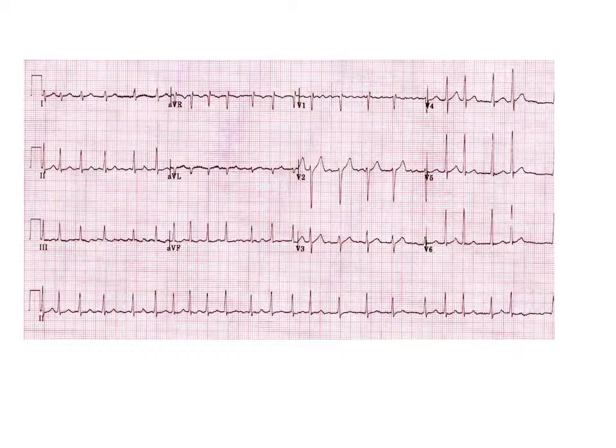All right. Rest of that, if you want to look at it real quick, lead 1 is almost isoelectric, but it's a little bit more positive than negative. AVF is all positive, so you have a normal axis. Leads 2, 3, and AVF: T waves, upright or inverted?